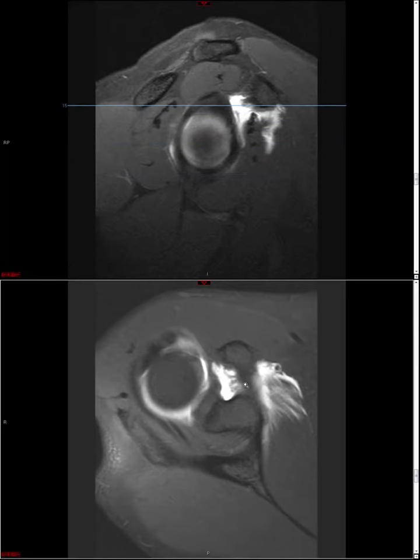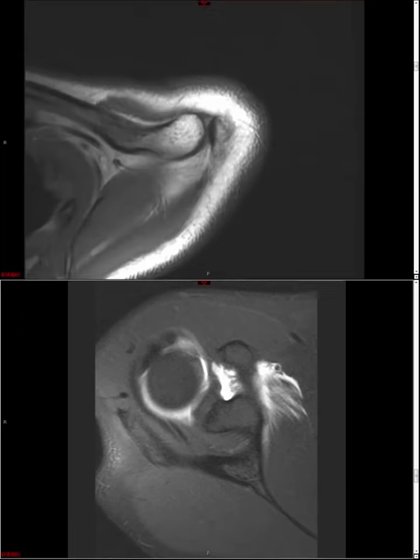All right, great. So just getting back to our general approach, which is the focus of today's talk. We talked about rotator cuff, we talked about biceps and how it's helpful to read it with subscapularis. We talked about the AC joint, the acromion, the bursae, and how to distinguish the subacromial bursa, which is extra-articular, from the subscapularis recess, which is intra-articular. Then we talked about glenohumeral articular cartilage, and had a brief overview of how to assess the glenoid labrum. And so now we're getting to that point in interpretation where we're just tying up loose ends. We're in the miscellaneous category.